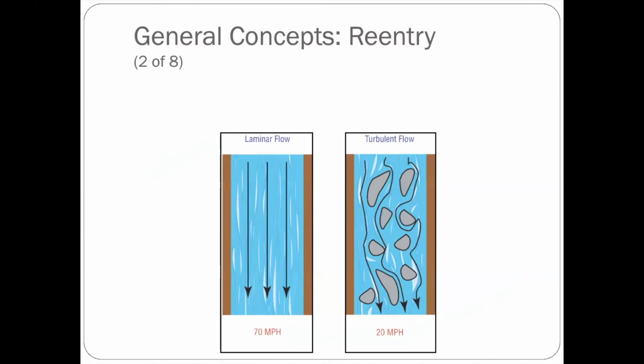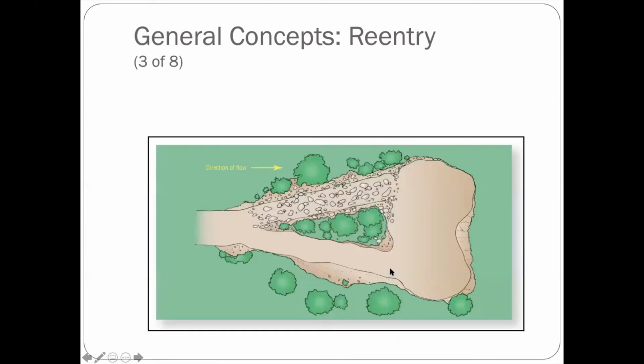So when we see that, oftentimes the conduction is getting to the AV node through that faster conduction, and the slower conduction is traveling through there, but it doesn't actually complete the conduction all the way to the AV node. And instead, the AV node will come back and finish that repolarization.